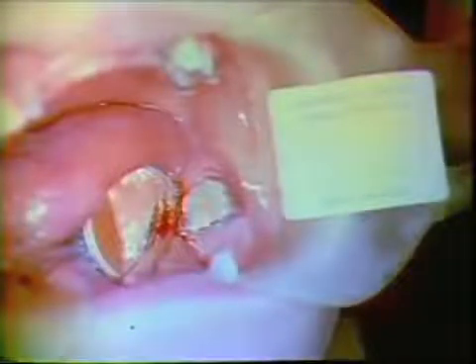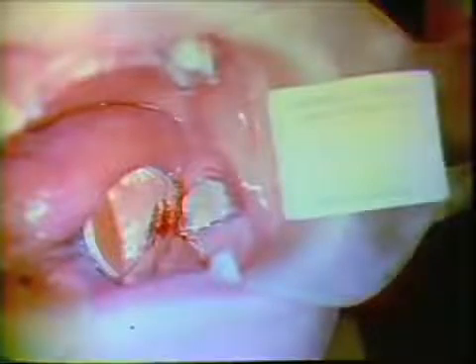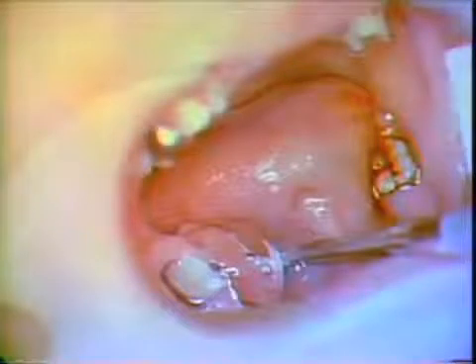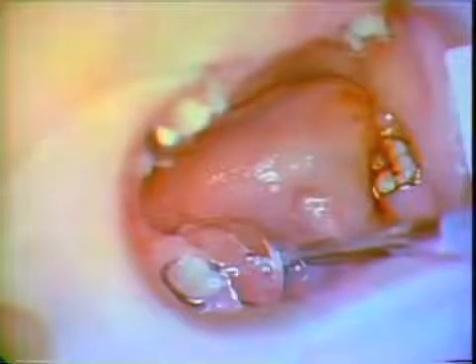This slide also demonstrates the irritation and hemorrhage occurring around vertical post lingual sheaths where a removable, adjustable locking wire is used. Another view showing the hypertrophy of the soft tissue and the irritation developed in the lingual sheath attachment.